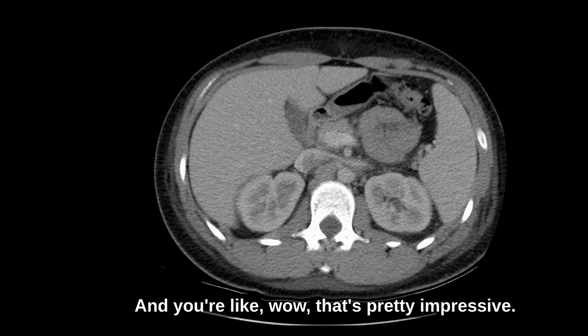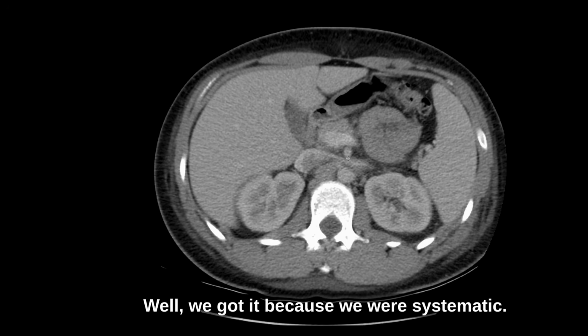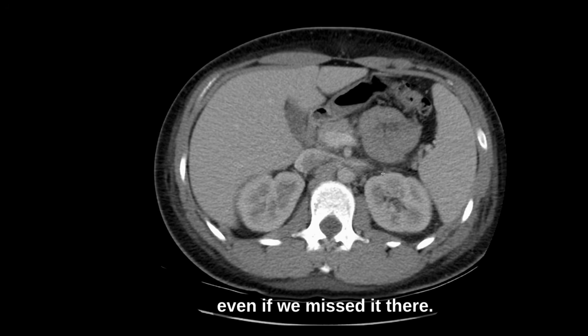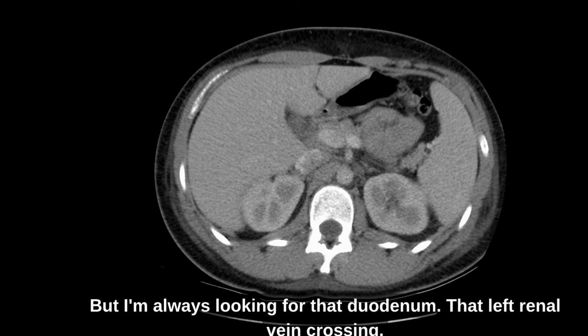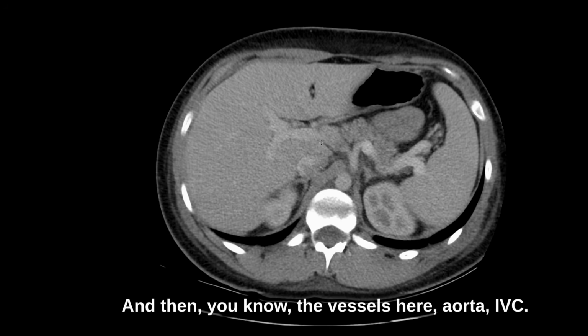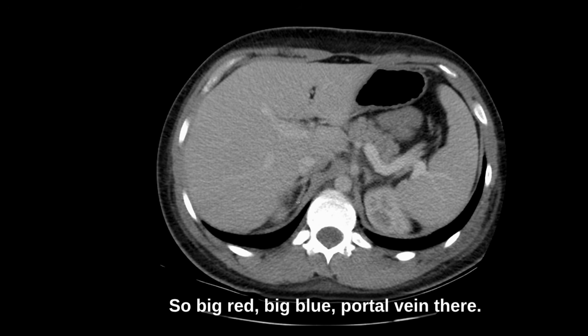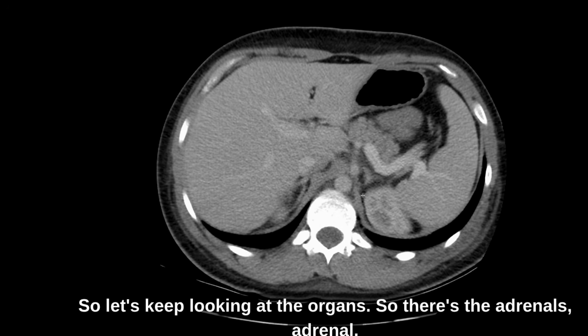And you're like, wow, that's pretty impressive. Well, we got it because we were systematic. And we're going to have one more checkpoint, even if we missed it there. But I'm always looking for that duodenum, that left renal vein crossing, and then the vessels here, aorta, IVC, so big red, big blue, portal vein there. So let's keep looking at the organs.